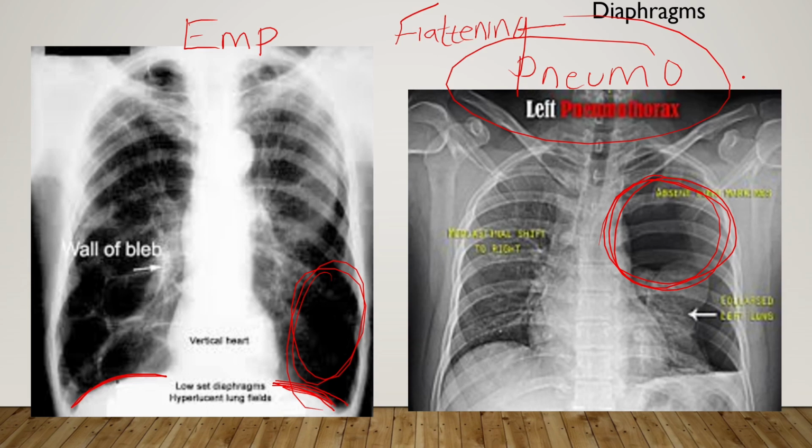Secondly, it can tell us about unilateral diseases. So emphysema was bilateral. Unilateral can be things like pneumothorax. Pneumothorax is unilateral, and again, same concept. You can see here on the non-affected side of the lung, you can see a nice hump. That's good. We want to see a nice hump. And when you look at the affected side, you can see a flattening diaphragm here, and you can be like, all right, there's a problem here. There's definitely a problem here.